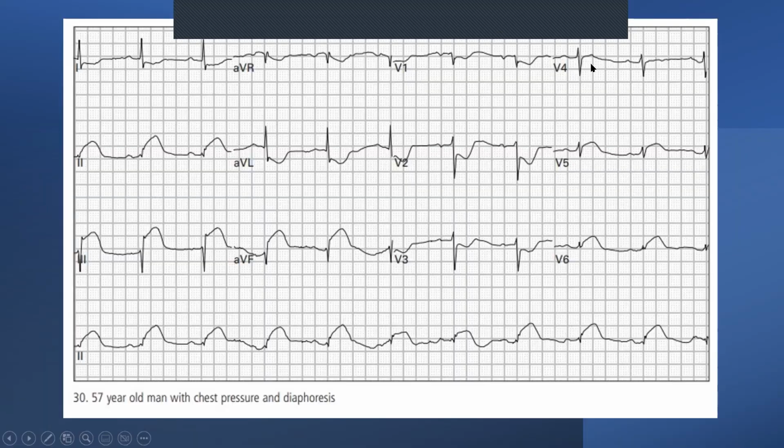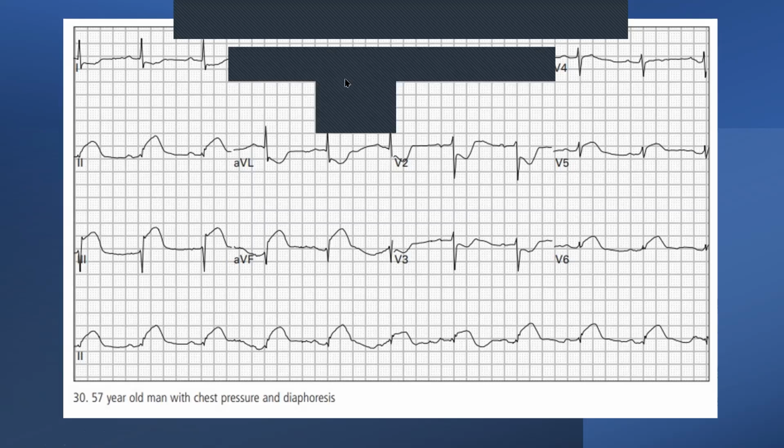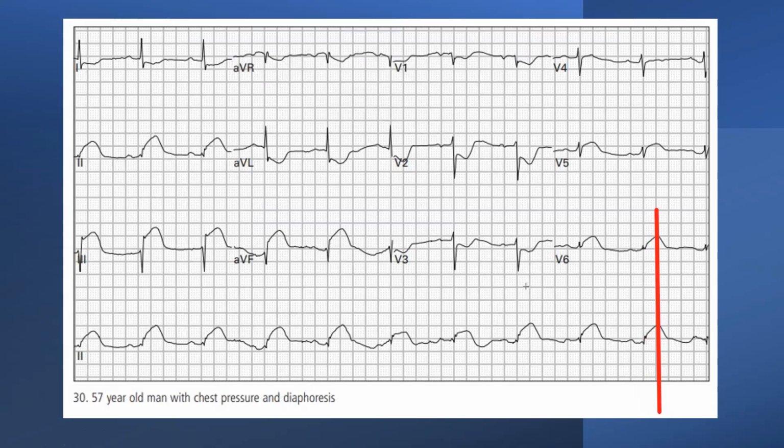So let's get into it. Let's start with the axis. As we know, we would have normal, left, extreme right, and right.